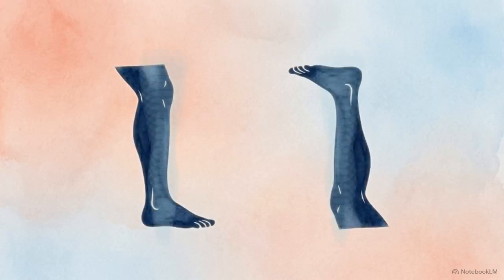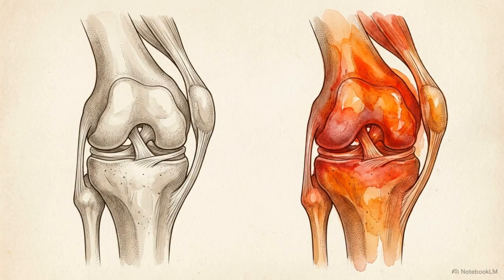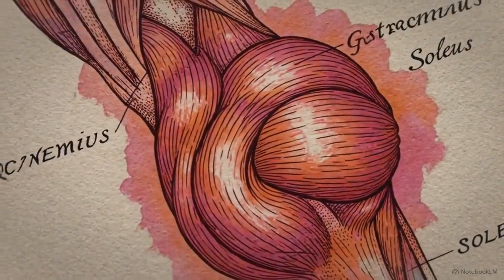This wireframe model demonstrates localized inflammation. A tight circular hotspot appears over the knee joint, allowing therapists to pinpoint tissue overload early. Then the hotspot fades, and a broad, diffused, asymmetrical heat pattern creeps up the opposite leg, visualizing systemic compensatory fatigue. A patient may be cleared of structural damage in their primary limb, yet still experience severe pain due to invisible compensatory overloads in the contralateral limb. Thermal mapping visualizes this ischemic or fatigued muscle tissue, revealing the true, often subclinical, site of the dysfunction.